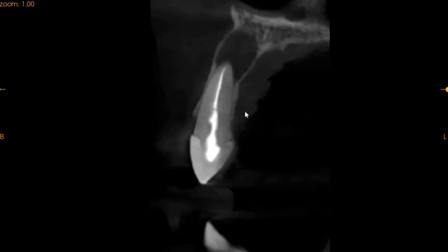This is the upper right lateral incisor. The root canal seems to be filled to the apex, however there are voids present and there is a significant periapical radiolucency associated with the tooth. We've got a 6.4 millimeter by 6.8 millimeter radiolucency. Now this is a considerably large cavity, and a re-endodontic treatment or a periapical surgery will definitely be needed. It's a very well-defined unilocular radiolucency.